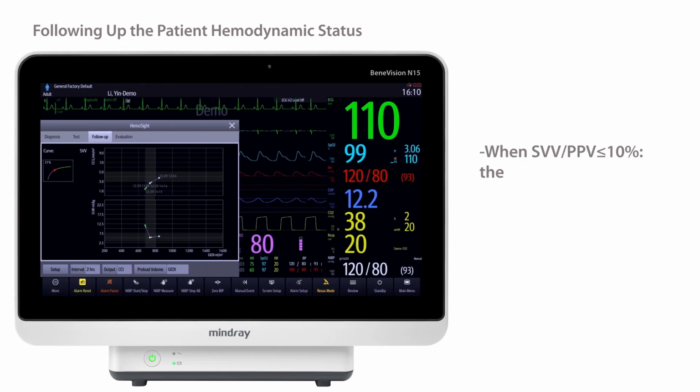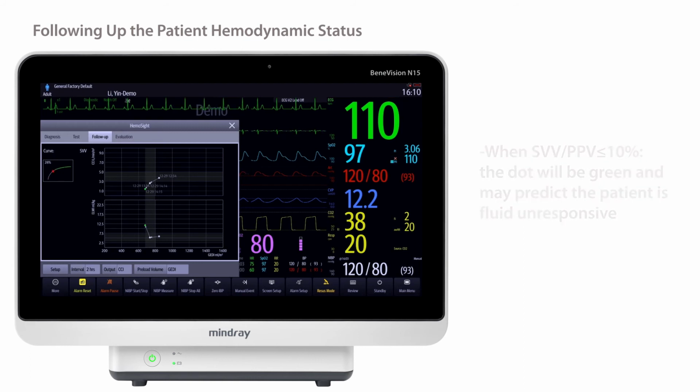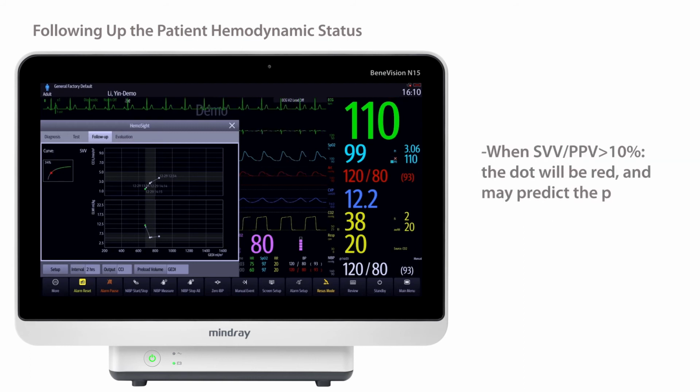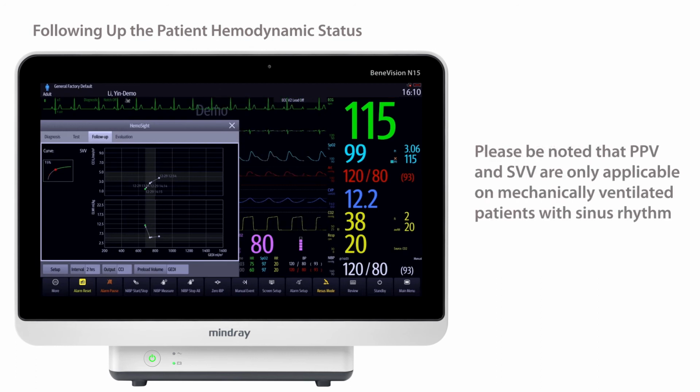When SVV/PPV is less than or equal to 10%, the dot will be green and may predict the patient is fluid unresponsive. When SVV/PPV is greater than 10%, the dot will be red and may predict the patient is fluid responsive. Please be noted that PPV and SVV are only applicable on mechanically ventilated patients with sinus rhythm.